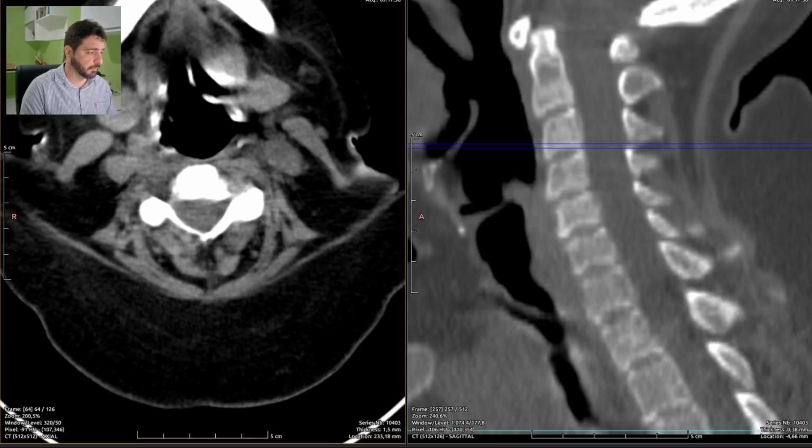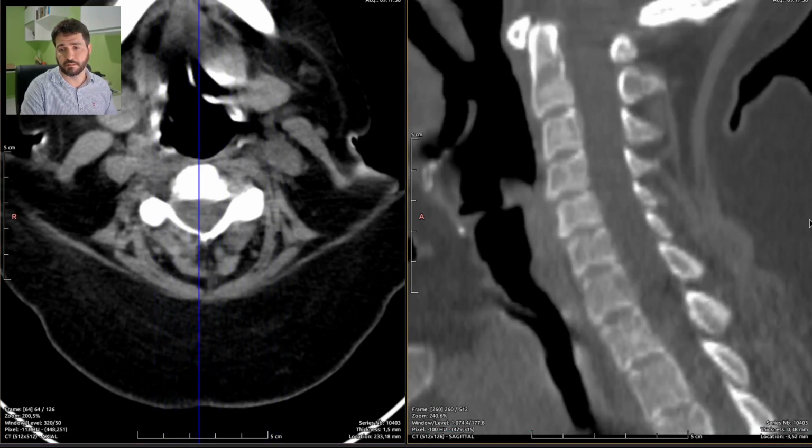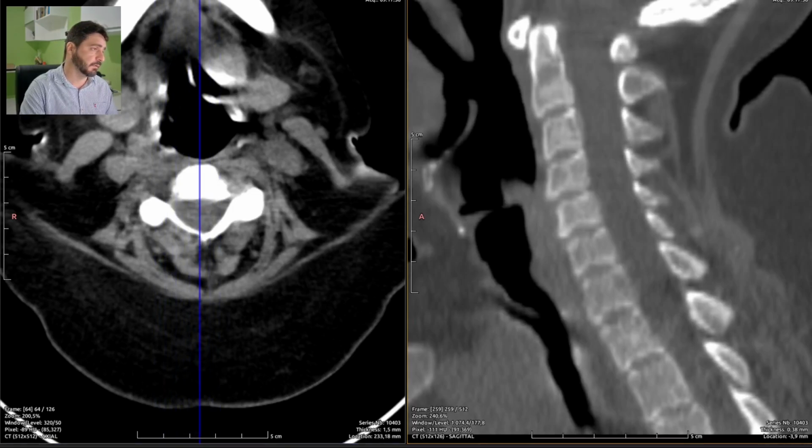Still I can't tell the reason for these exams. I thought this was a trauma case, but it seems it isn't. And I still can't tell why this is what it is. But let's go to the next one.